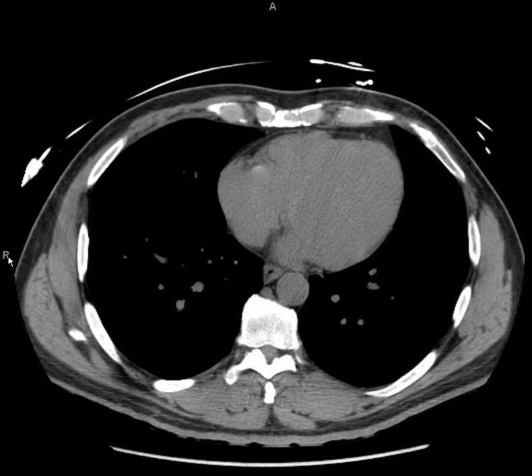Every once in a while, the radiology tech will orient it for you with an A for anterior or an R for right, so you can help orient yourself. Sometimes they put it in backwards because it's a preset in the machine, and if they put the patient on the table the opposite of the way the machine was assuming the patient is laying down, then the R will be over here. The patient's image might be flipped, and the R would be on the right, but the patient's left is on that side. So you have to look at the image and figure out if it matches up or not. And that's traditionally the way it's done.